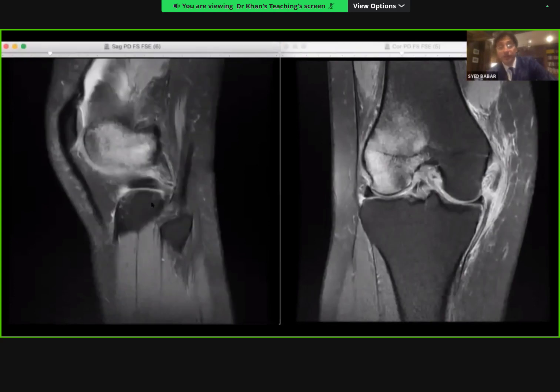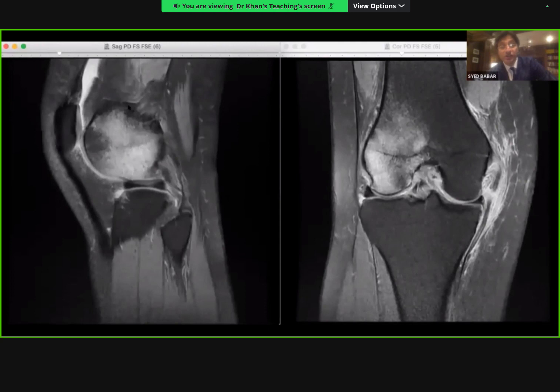So on the first, as I would normally start, if I just see lots of bone bruising of the lateral femoral condyle, I know this is an impact injury. It's not a twisting injury, for the simple reason that there is no bone bruising at the posterolateral tibial corner. So this patient has had an impact on the tibia, so on the femur. So let's follow our routine.